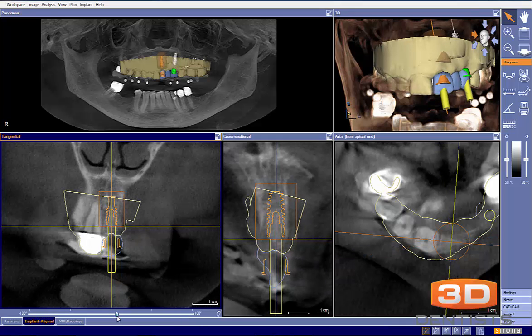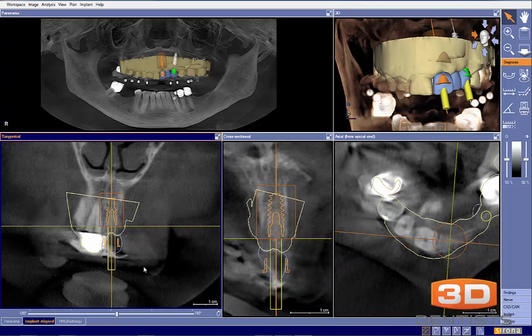Now the other thing that also makes me think that is, we look at the occlusal plane in our checklist, and one of the things I can see here is that our occlusal plane is not level. It is going like that. So I prefer to have it come straight up and down here, like so. So to me that's a relatively easy fix.